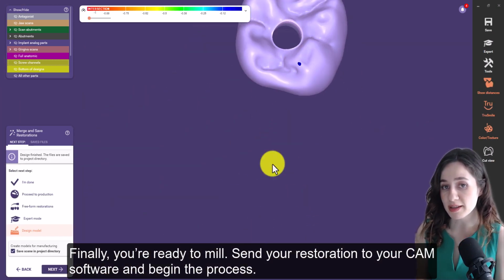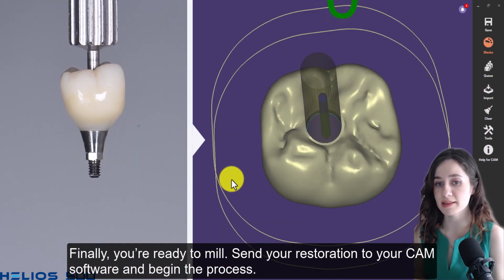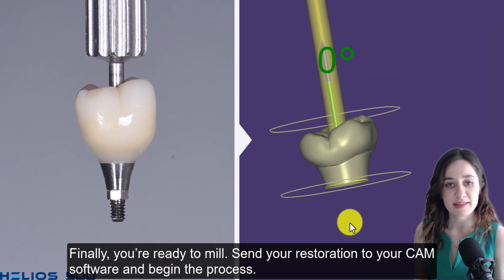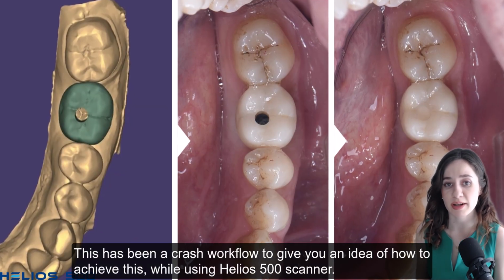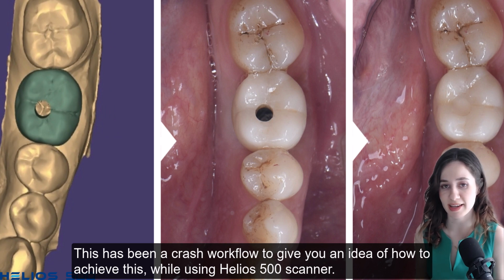Finally, you are ready to mill. Send your restoration to your CAM software and begin the process. This has been a quick workflow to give you an idea of how to achieve this while using the Helios 500 scanner.